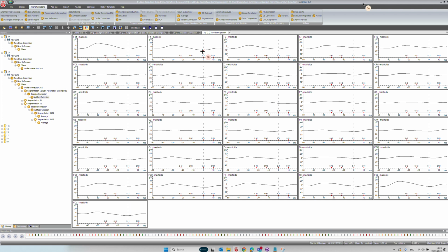What does minus 120 mean? It's very important to know what minus 120 means here, right? Because we are dealing with these little adjustments that are little but important. There seems to be a little misalignment here of the time scale, but generally these are 10 milliseconds apart from each other, right?